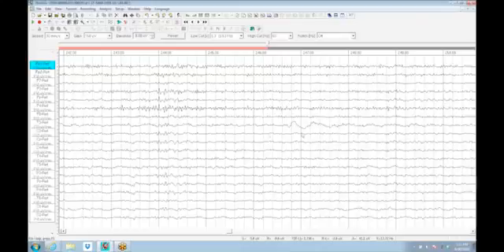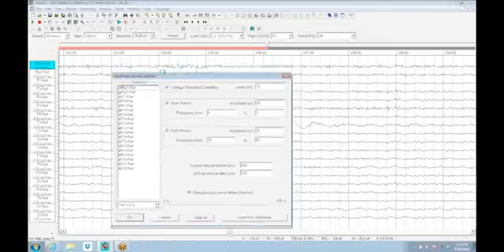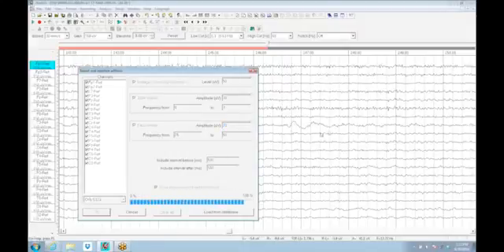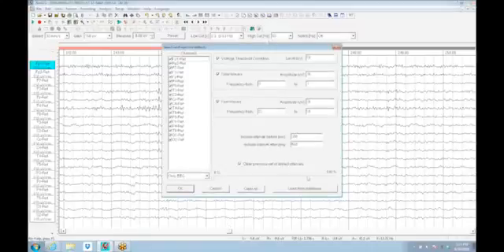But at this point, we can fine-tune this because we now see that there's these subtle little ones here, and we can get this down to maybe 50 microvolts and drop this maybe to 30 microvolts, and the EMG will leave at 20 here, and we can clean this up a little bit. We want to try and catch some of these little transients, and the size of those ends up being such that you can fine-tune these again.